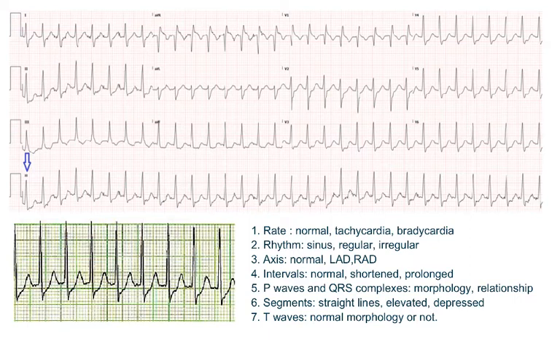First step is the heart rate. It is tachycardia. See the RR interval? They're very close to each other. How about rhythm? Is it sinus? No, it's not sinus because in this ECG there are no P waves. It's QRST, QRST. Look at the zoomed part as well. It's QRS and T. There are no P waves. Next is to see if it is regular or irregular. It looks regular. The R waves are at an equal distance from each other throughout.